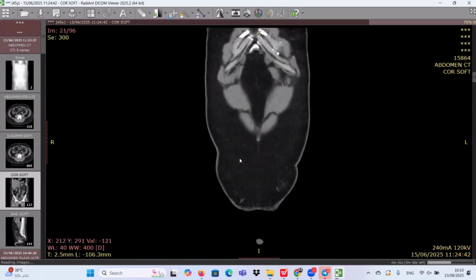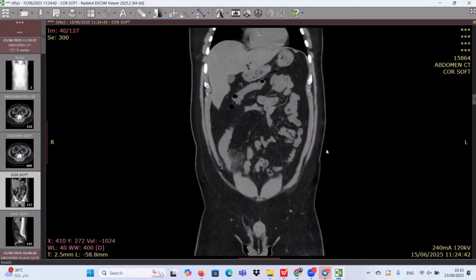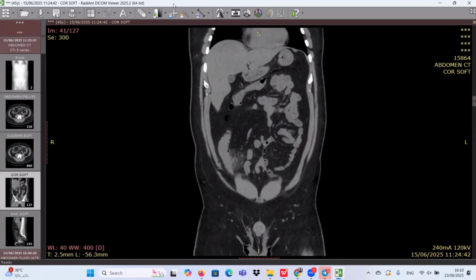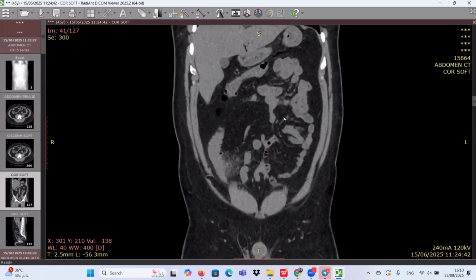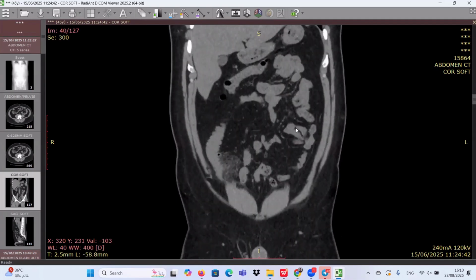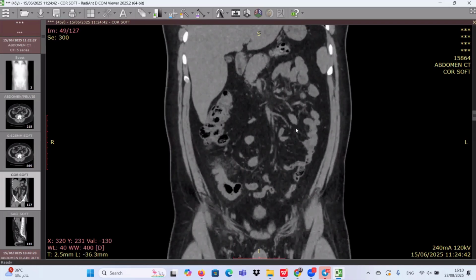Yes, sir, sure. The coronal plane reconfirms my finding of inflammation around the sigmoid colon with a few tiny nodules noted within it. So I'm thinking, again, of complicated diverticulitis in a redundant sigmoid colon, and I could appreciate no other abnormality on the non-contrast coronal section.